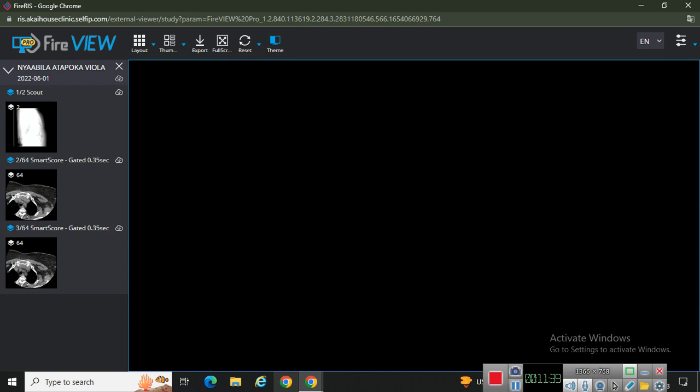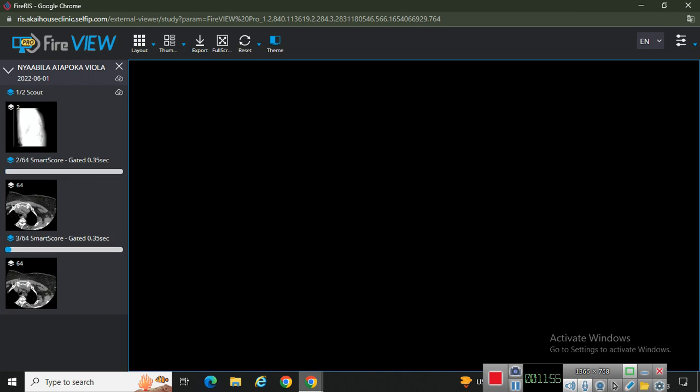So let's say I just want to have a look at this. I preload this so that when you scroll through, it doesn't hang. So you can preload them so that when you drag them onto the canvas and you scroll, they don't hang. Makes your work smoother.